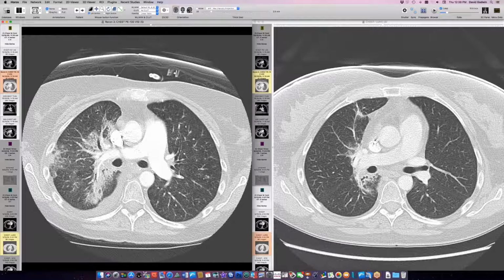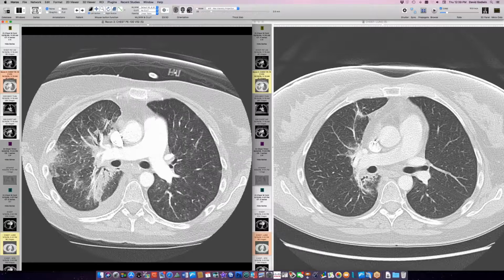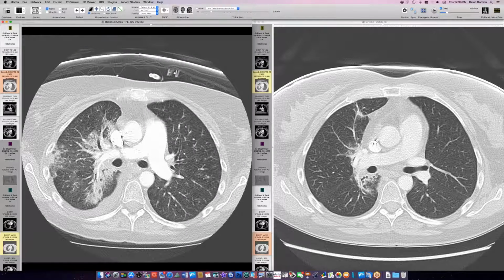So this is a case of recall pneumonitis, which can be triggered by some chemotherapy agents that are considered to be radiomimetic. Somebody may have mature radiation fibrosis, not very active on PET and so forth. You put this person on one of these agents that mimics radiation, and you can bring back the radiation pneumonitis that might have been there earlier, but probably wasn't imaged because it was a typical finding after radiation. So this is recall pneumonitis in this person.